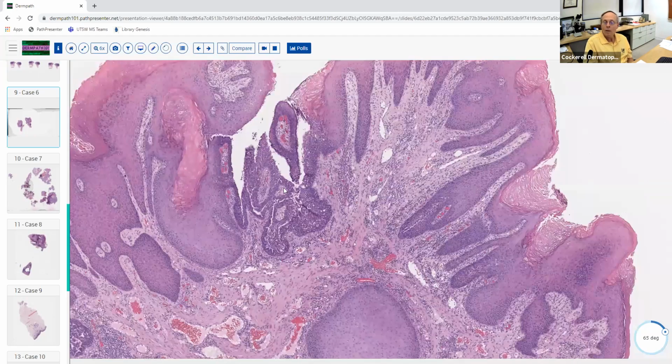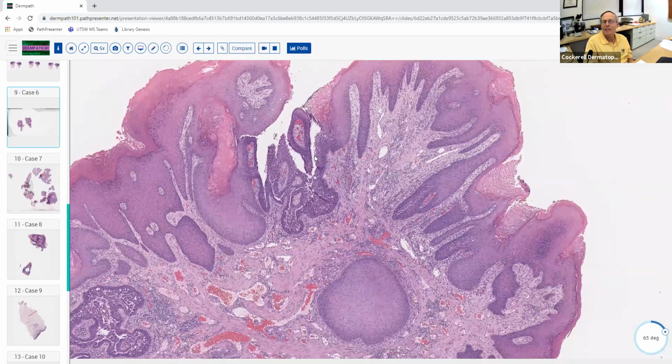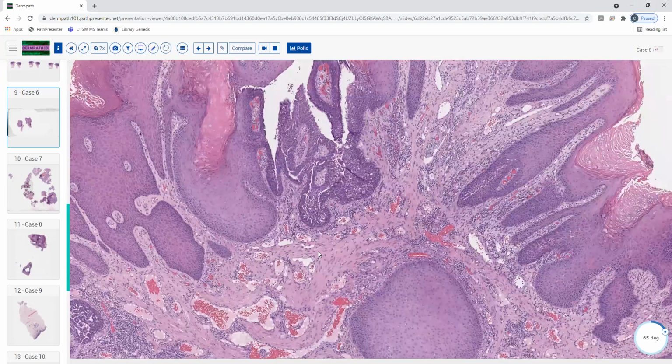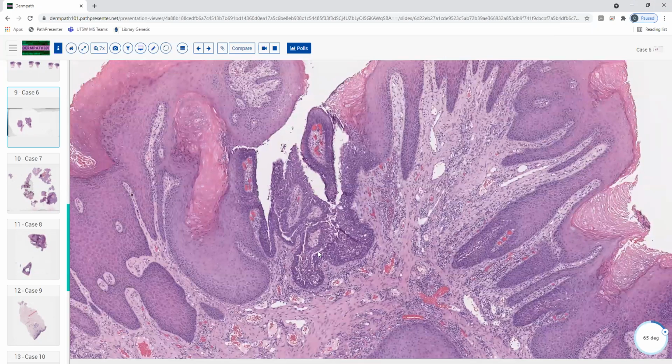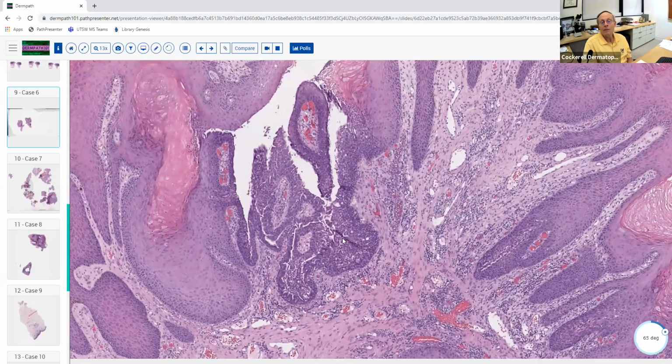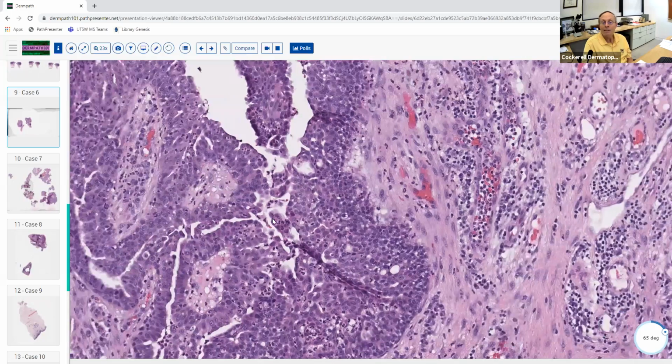So that's fairly common. And here's another area on this side over here. Where's the most common setting where we see these lesions? I know they're typically on the scalp, and I know they can arise from a nevus sebaceous. Yeah, depending upon who you read, it's either the most common or the second most common adnexal neoplasm associated with a nevus sebaceous. The other things they get are benign trichoblastomas that look like basal cell carcinomas, but they're really not. This one's a very common manifestation of it as well. So this is a classic example of that.